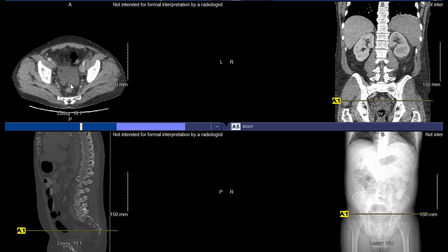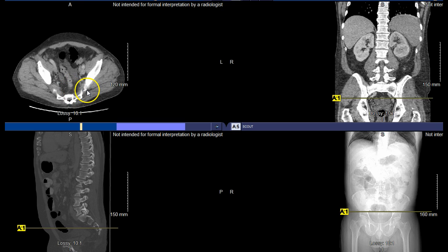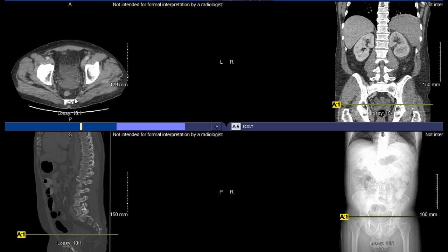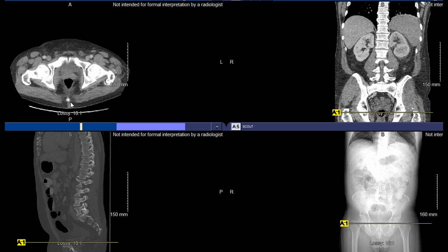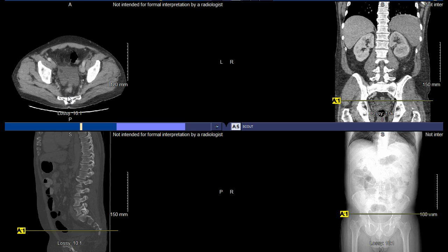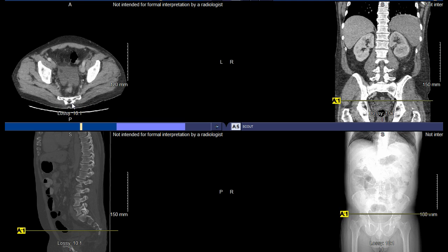As we continue to go down, you can see that the sacrum, at the point of the SI joints, is getting more and more narrow. So we lose our SI joints; that articulation is not taking place. As we continue to go down, you're looking at the transition into the coccyx region. You can see the coccyx there, and gone. Then we're out of bone in that regard. You can see that transition taking place. And those sharp little points are the cornu, so the sacral and the coccygeal cornu are what's being demonstrated there.